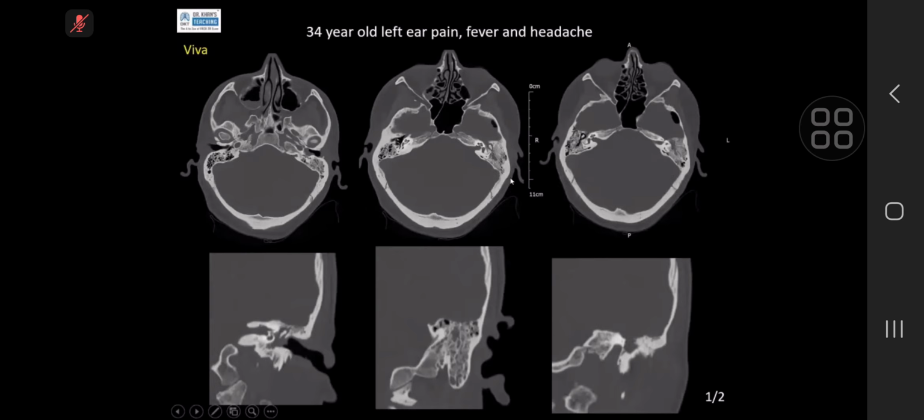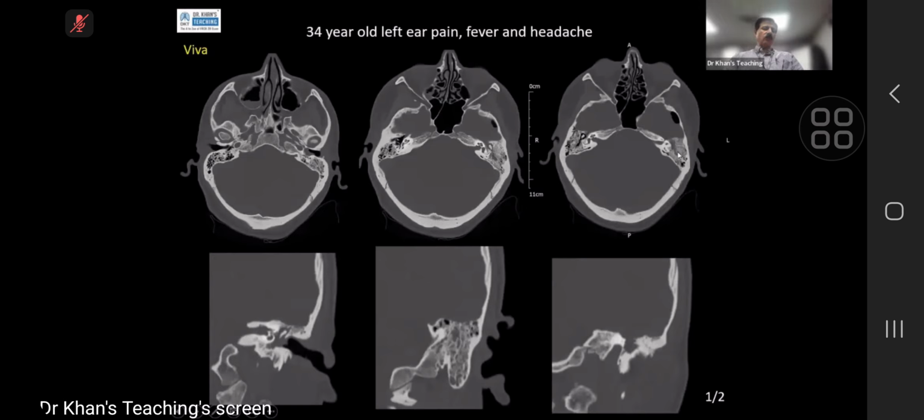So there appears to be a locule of gas within the temporal, within the middle ear cavity, right? Yes. Apart from the middle ear, I'm using the wrong word. Middle cranial fossa, right? Okay. Yes. Now, maybe. So, have you seen any bony abnormality? What is your conclusion? What has happened, and what will you do next?